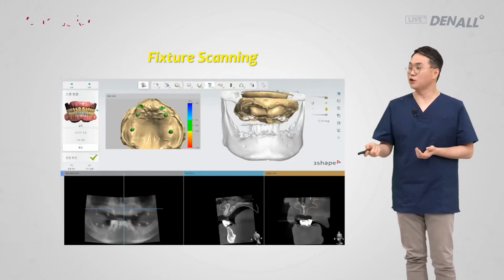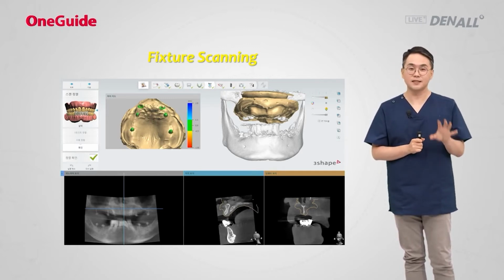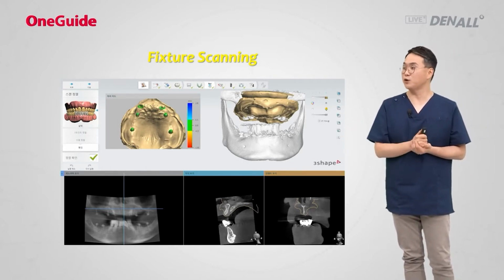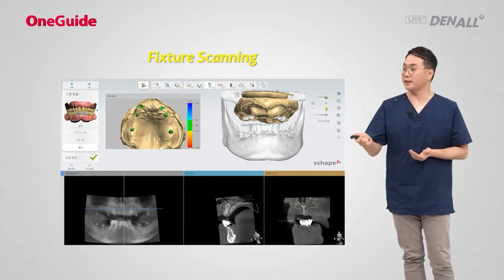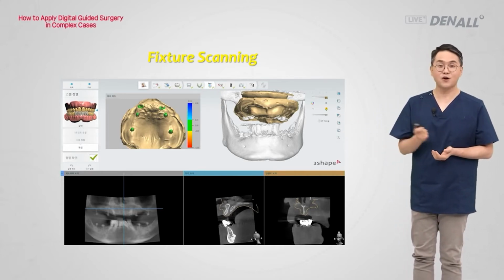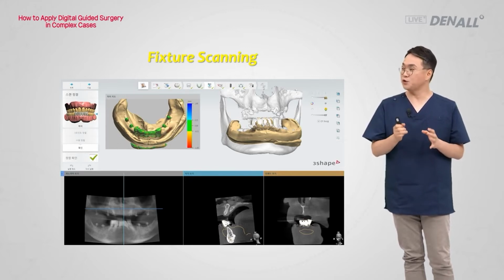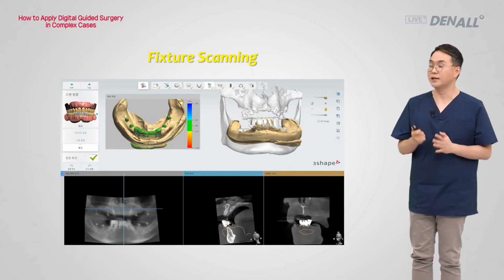If you look here, superimposing gingiva is not possible because it is pressed down during impression or CT taking, and a clear outline of gingiva cannot be found on the CT. As you can see, the color green means accurate merging is achieved without distortions. Based on the radio-opaque markers, that is the flowable resin, accurate merging is achieved. The same is true for the mandible. The radio-opaque markers, the resin, on the teeth and 4 ortho screws appear green, indicating accurate merging.